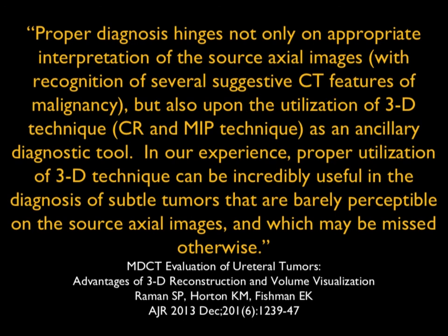So I think it's very important to recognize, and I'll show you examples, that it's so easy, particularly in older patients, to miss subtle tumors, just like it's easy to miss stones. In fact, when you have fat, you have poor tissue planes, it's very easy to walk by things. You really need to be careful. And the ureters are one of the areas where I see lots of misses.